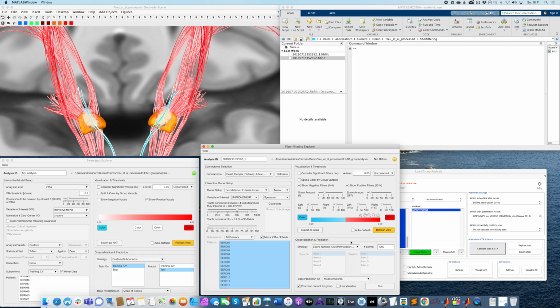But now what we want to do usually is to cross-validate data. We would usually do the same thing as we did here, right? So we would create a sub-cohort only on the training and cross-validation set. We would then do cross-validation here, and once we have a good model, we could then apply that to the test set to make the final test. But for the sake of brevity, I will now do cross-validation on the whole data set.